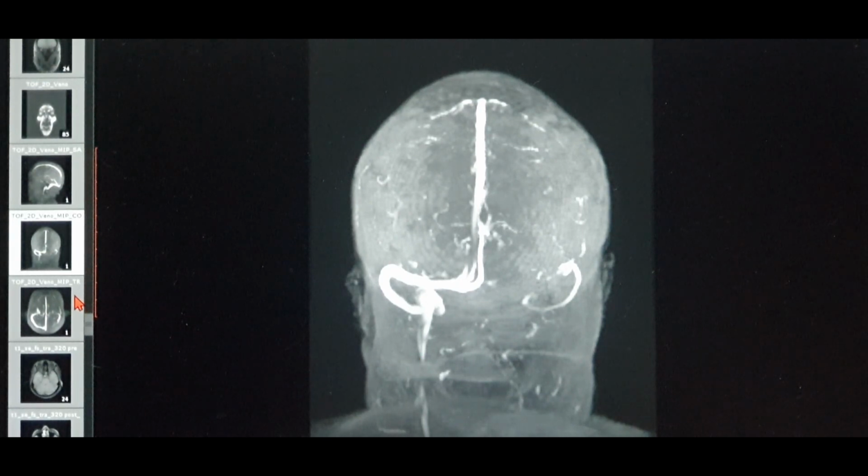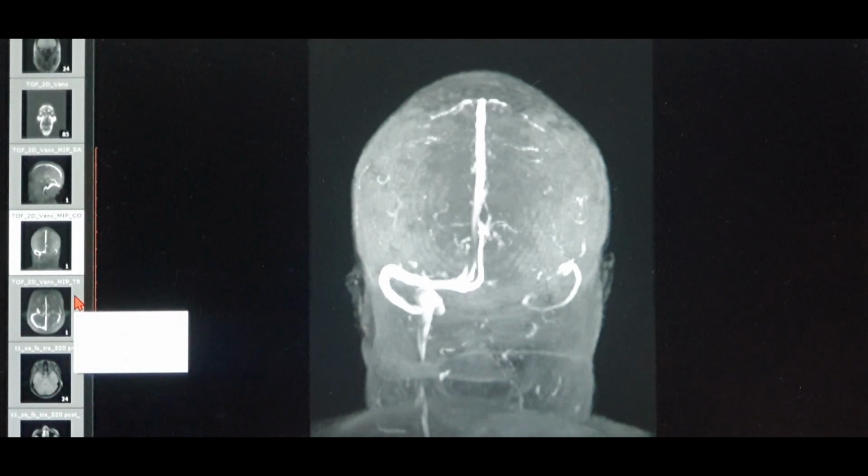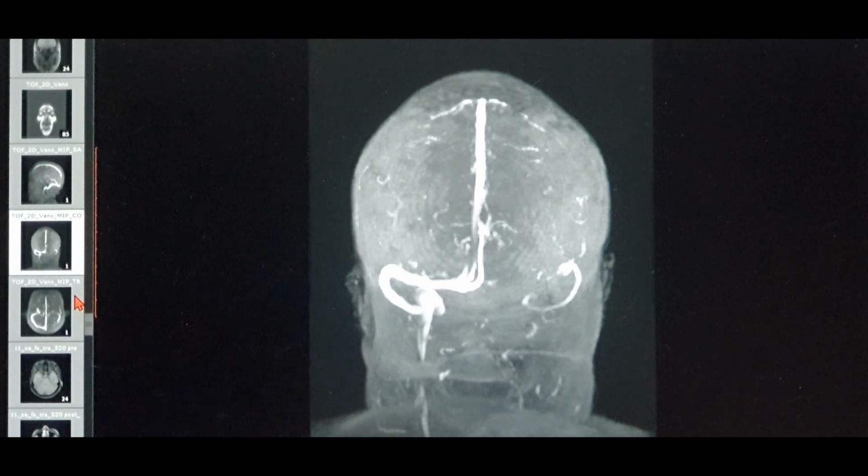Even if you're a student, if you watch this video and learn from authentic books, I'm sure your concepts are going to be very easy. For MBBS students, they can always refer to BD Chaurasia anatomy. If you're a postgraduate student in skull-base ENT, you can refer to the skull-base books. If you're a neurosurgeon, you can refer to the skull-base books of your surgeries. Once you clear this anatomy, any examiner will be impressed with your answers. So this is about the venography on the MRA.